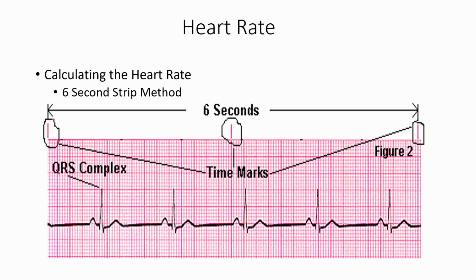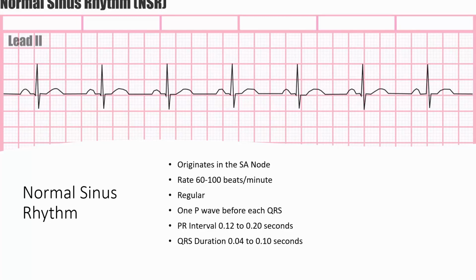So let's practice. Let me go through here and we'll practice another one. Okay, here's another one. Let's look right here. Let's go ahead and practice all of our parts. So this is baseline. This is P. Here's your Q, R, S, and then here's your T.